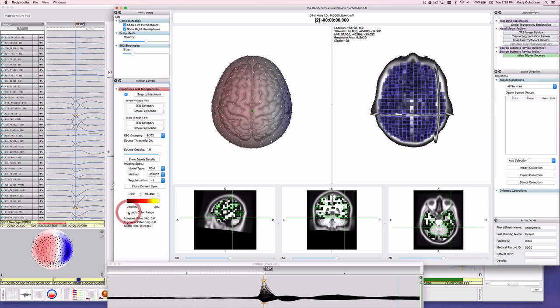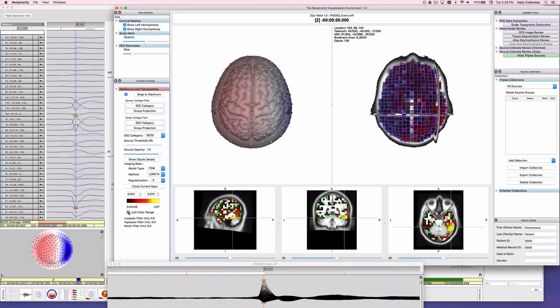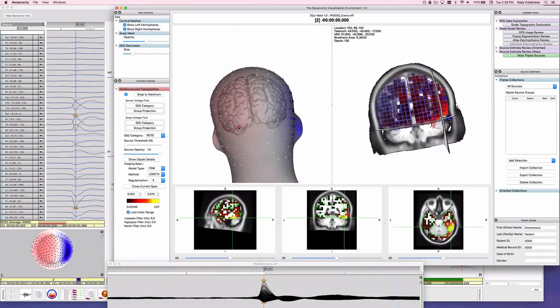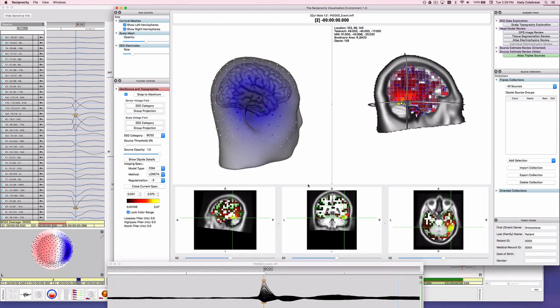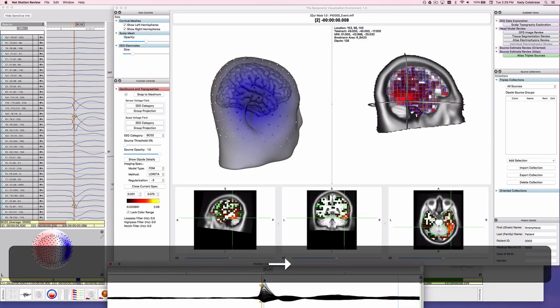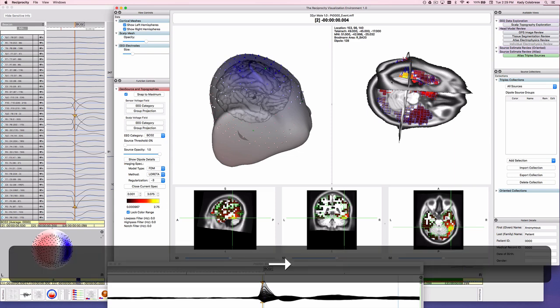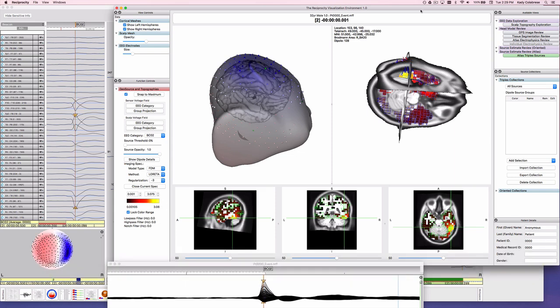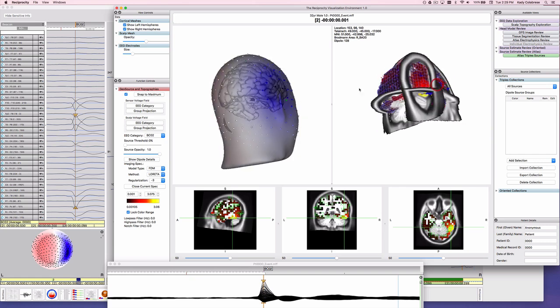In an Atlas model, the information cannot be displayed in the same way because the orientation of the dipole to the cortical surface is unknown. The vector is going to tell us the orientation of the dipole at that voxel and the direction of the corresponding potential fields generated at that voxel. The color palette of the source results is only used to describe the intensity of current at that location. Compare the results with this model to the previous model.